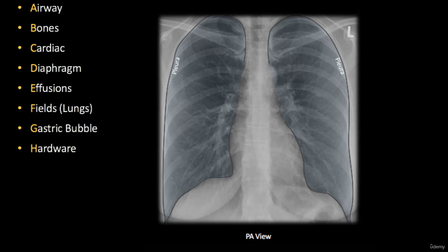Hypertransparency of the lung field is a sign of lung emphysema. It's not very good. That means we have too much air inside, which cannot find the way out. And have a look, we have no space between the lung itself and the thoracic wall. They are absolutely adjacent. We have the layers of pleura there, but they are invisible on the X-ray. Any content like air around is an indication of pathology.